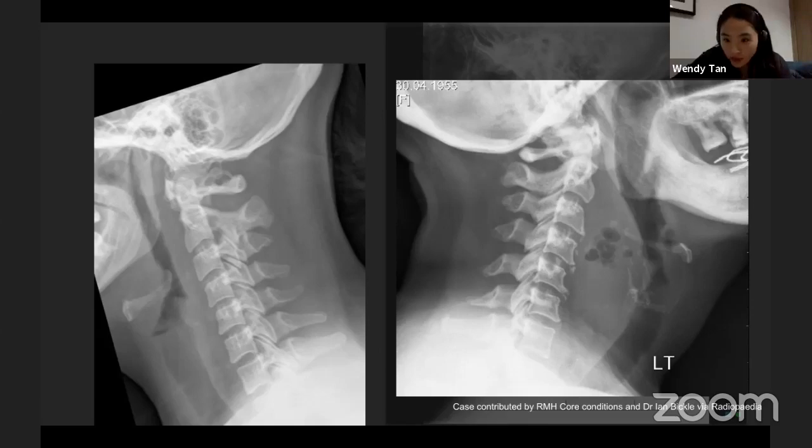People mentioned air. Someone said retropharyngeal abscess. Yes, well done. Ding, ding, ding. So when you see air in soft tissue, unless you know that's an injury and it's surgical emphysema, if someone is presenting with an infection or with raised inflammatory markers and you see gas in the soft tissue, you need to think about abscess and gas forming pathogens, basically.